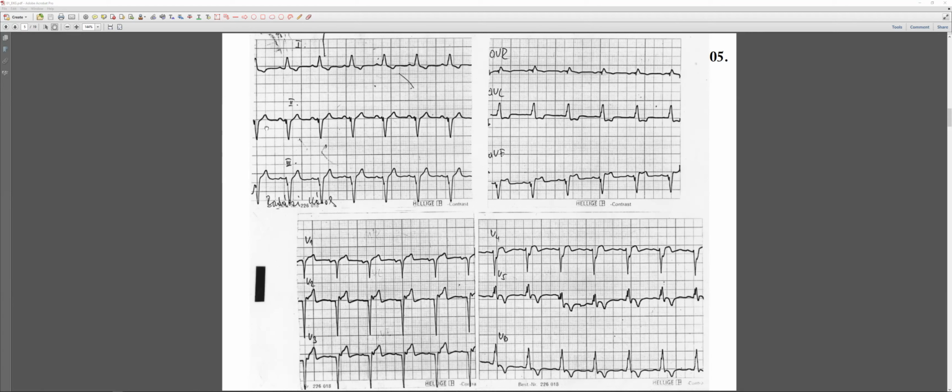All right. So first off, this looks like a standardized normal ECG. I will start with the rhythm. It appears rhythmic with P waves, so it's a normal sinus rhythm. The heart rate is 1, 2, 3, about 80 beats per minute.